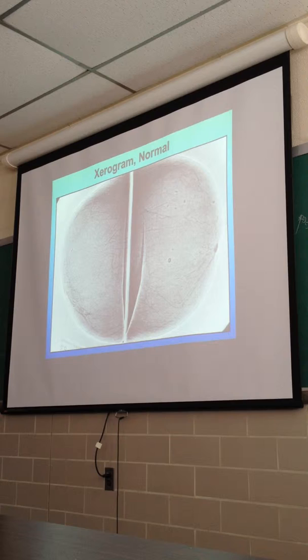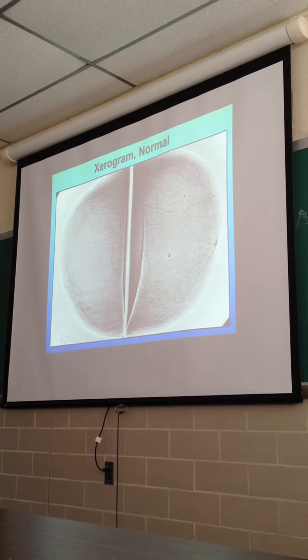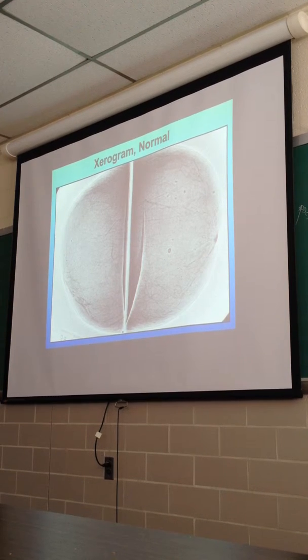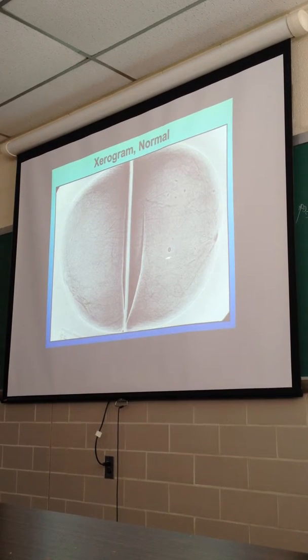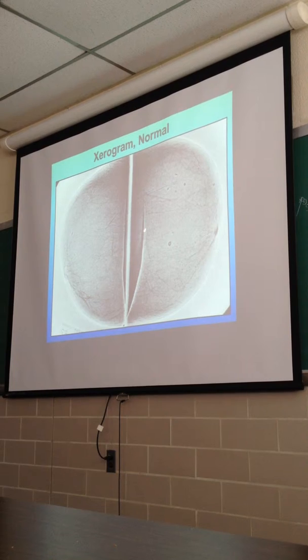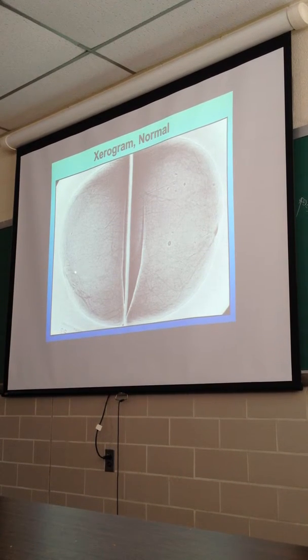Can you tell the difference between a standard mammogram and a xerographic mammogram? It's a xerographic mammogram, again with the breasts side by side. Again, you're scanning right across, looking for symmetry. Okay, what is that? Benign or malignant? Benign. Can you point to that again? Right there. Those little lines on the right breast. It could just be tiny scratches within the film maybe. Is that what that is?